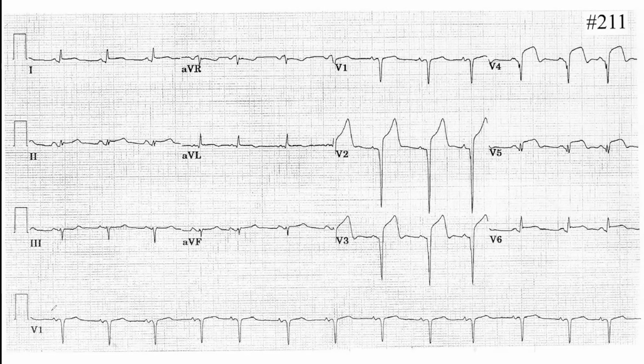So I think this is rhythmic. And the heart rate is about 1, 2, 3.5... 3, 3, a little bit more than 4, so it's around 90. Okay, good. And there are P waves. Yes, every P is followed by QRS, and these are sinus P waves.